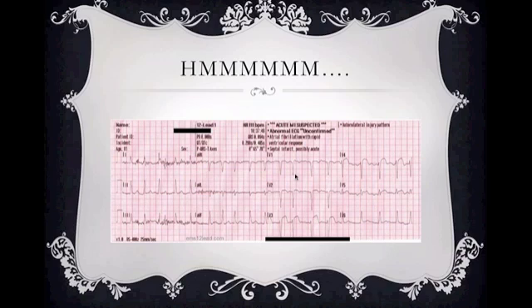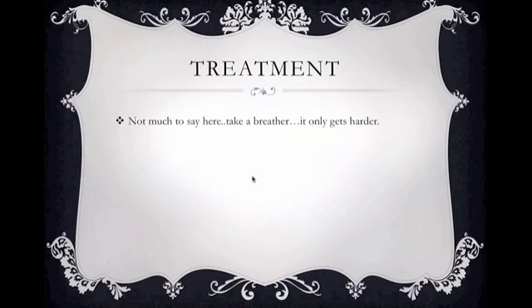All right. I show this EKG to everybody at my station, and they diagnose this as having an anterior wall MI. And this is scary stuff. All right. We're still going to be calling STEMIs on this patient, but they're going to end up having a ventricular aneurysm as well. All right. So cool stuff. Reading our EKGs is an art. All right. So as far as our treatment, like we said, not much to say here.